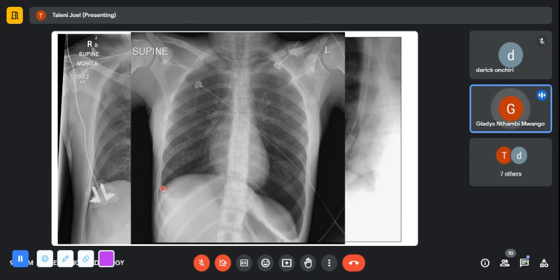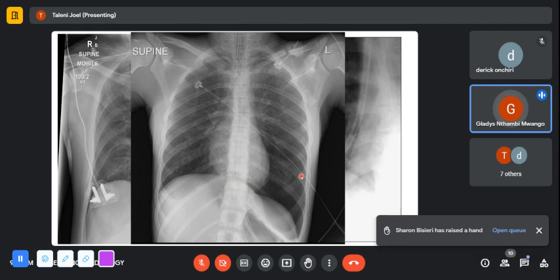You see on the right side medially. Just where the heart is, you don't see it, but you are seeing it much more with more clarity on the left side. So it's not continuous. But you can get continuous in a pneumomediastinum, if there's a pneumothorax. So again, you look at the entire clinical picture. Yes, Sharon.